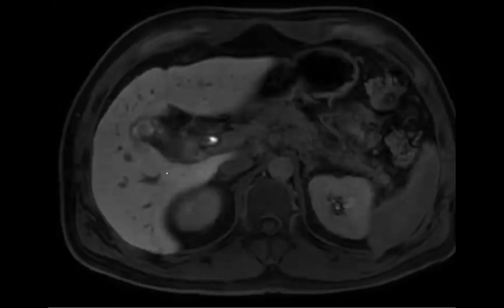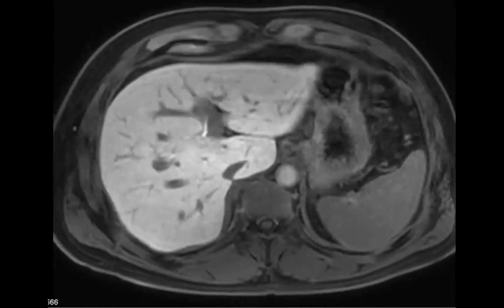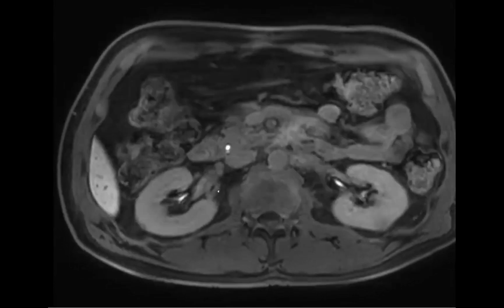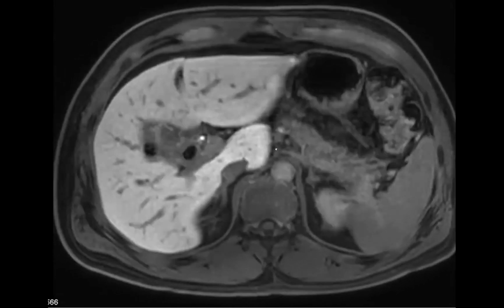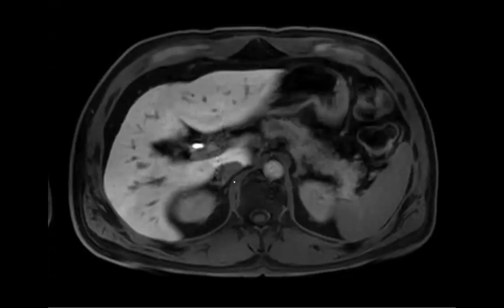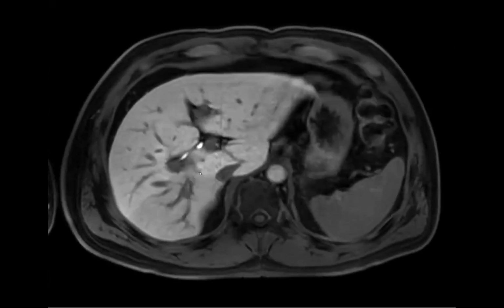And you can see at that time the parenchyma was still functioning okay. So over time, this parenchyma is going to atrophy a little bit. I've seen cases where eventually it stabilizes, but I've also seen cases where it just continues to shrink down. Anyway, it's not like a miss that's detrimental to the patient, thankfully, but it is an important finding to make.